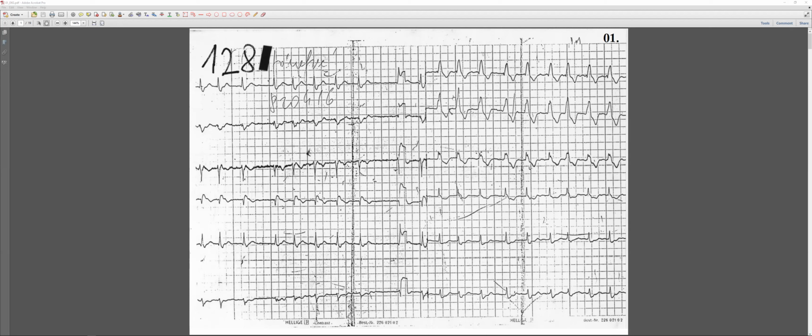The heart rate could be about... You can point with the cursor. Okay, so left click, and after you can use it. Can you see my cursor moving right now? Anybody can see? Yes, I do see. Okay, good. So the heart rate is about, I think, 105 beats per minute, which is a tachycardia.